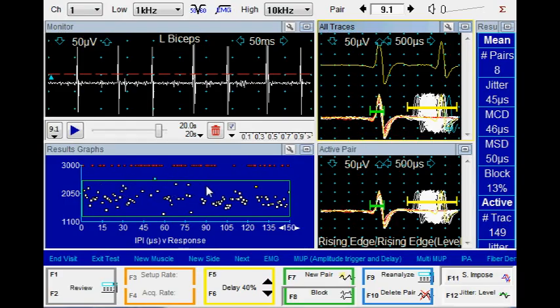We have this box which represents mean plus 3 standard deviations by default, which excludes some outliers automatically. As we have seen in other signals, I can change the height of the box, I can change the left edge or the right edge or the bottom edge to exclude outlier potentials. This makes trace editing very easy.